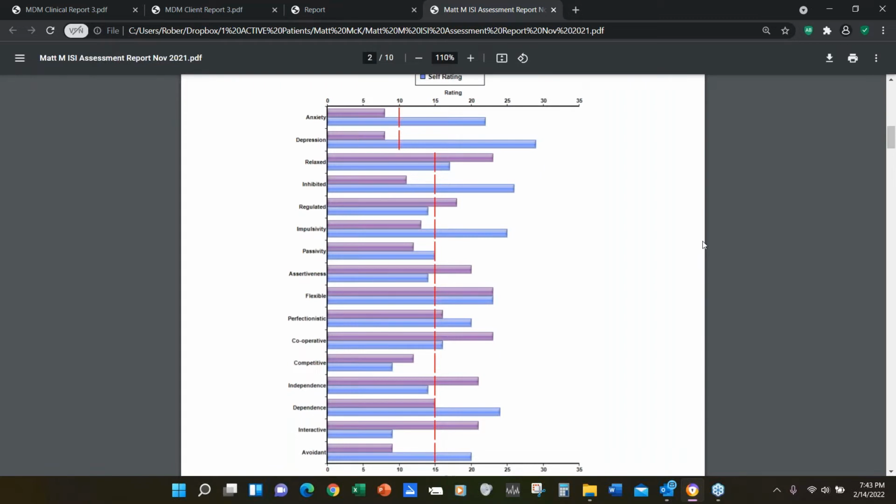So I do all that as well because I review it again with the map, and then I try to tie these into the map. So when I go over the map, I can refer back to the physiology and say, you see you have some high spots here in your delta and theta range of T3 and T4, and those oftentimes are indicators of blood sugar. And you've indicated you have some blood sugar issues, so that's that. And, or things like the really low, globally low alpha and adrenal fatigue, and so I try to tie each of those in. Of course, the CEC, like you said, Judy, is right there. So when you go over the map and the dashboard, you can't miss it.